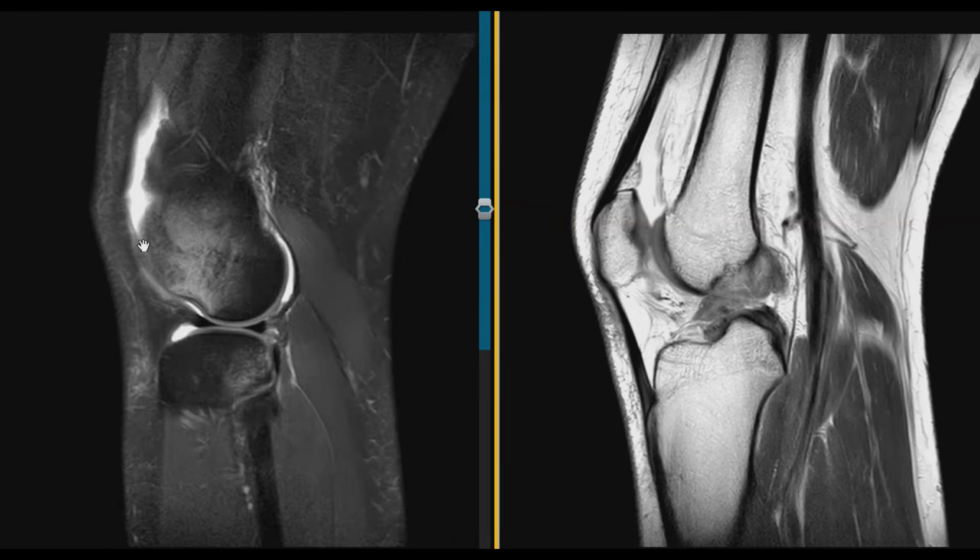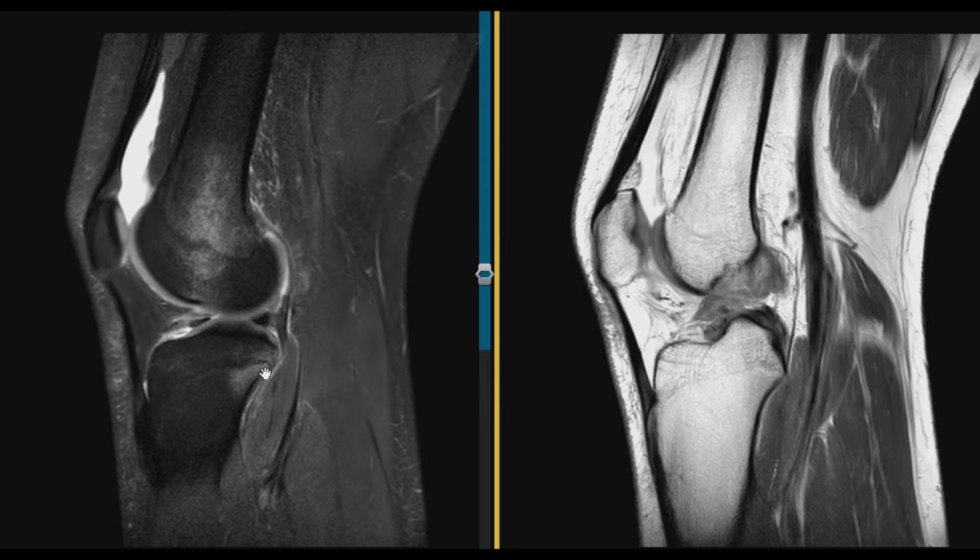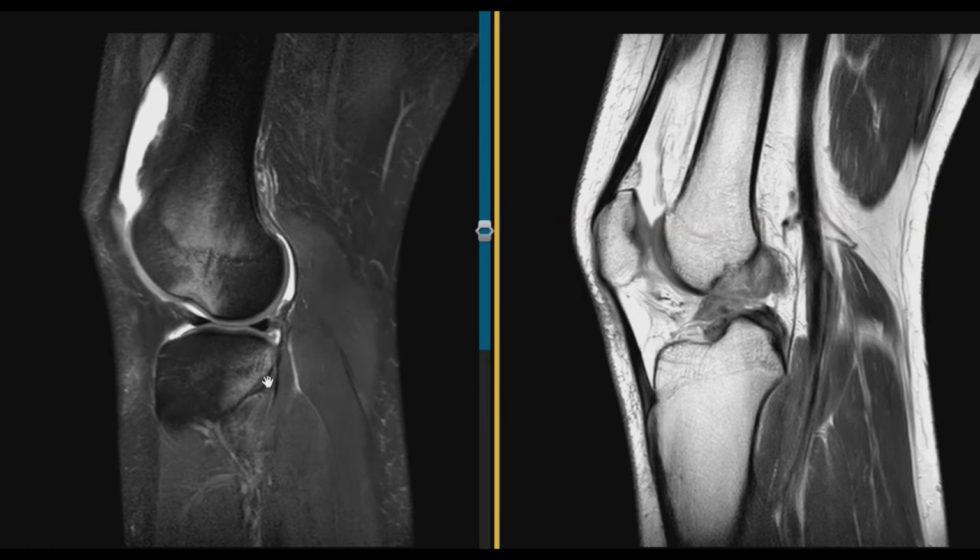This is the lateral femoral condyle. Normally it's nice and round and smooth, but we see a little divot here. This is where the tibia has impacted. We see the marrow edema back here. So the patient's knee was probably flexed a little bit, and this bone way back here slipped over here, hit right here, and impacted this bone, causing it to be cupped like this, and then it jumped back to normal position. So a long distance this went, and had a significant injury of both of these bones.